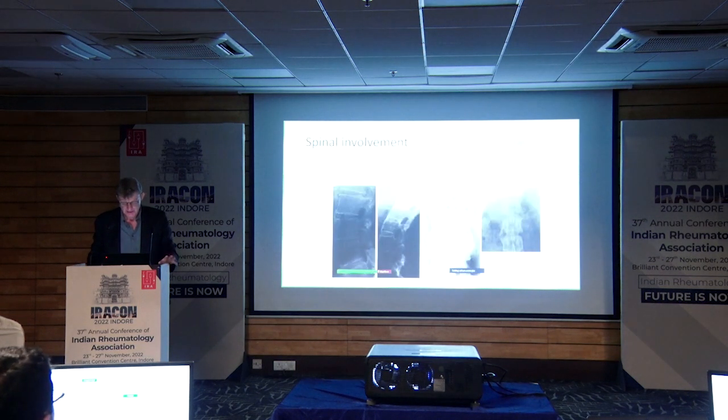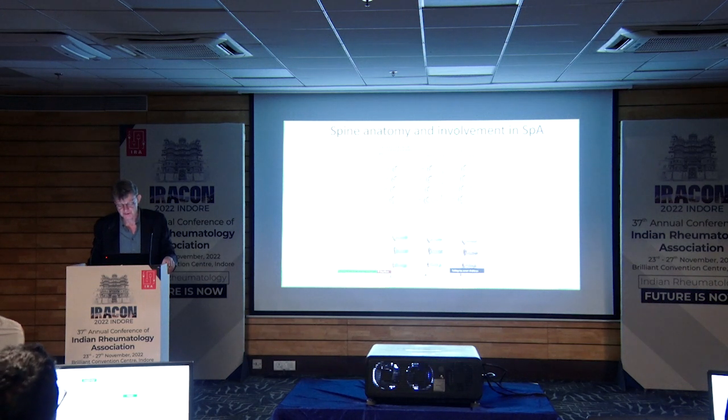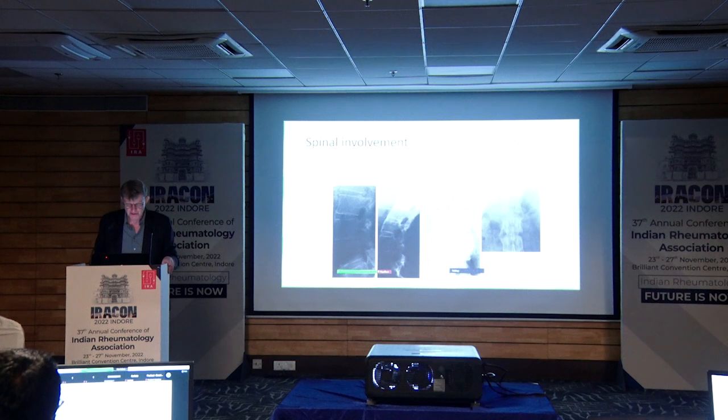This is not so good. This just illustrates that you can have inflammation in all different areas. It's not so interesting. What you could use this for is to illustrate that in these outer fibers of the annulus fibrosus, sometimes there is ossification and you make new bone, a syndesmophyte, which then goes towards the next vertebra, and it can also fuse, making bridging syndesmophytes, and thereby you have ankylosis. And that's what you can see in the end stage of an X-ray.